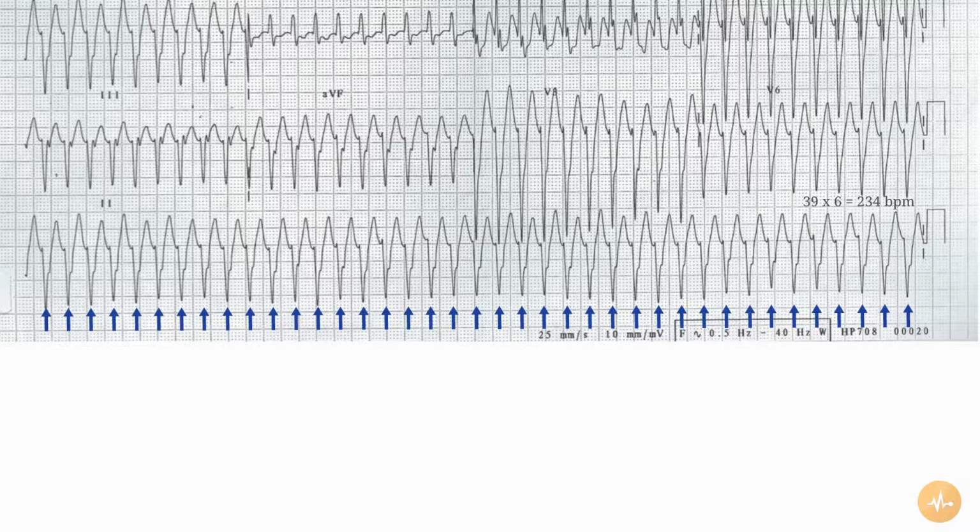This is therefore broad complex tachycardia and should make you think that the patient has ventricular tachycardia. In addition, one should treat the patient and not the ECG, and a combination of a rhythm at 230 beats per minute with hypotension and depressed consciousness should make one think that they need to cardiovert the patient, irrespective of whether this is a supraventricular or ventricular rhythm. The rest of the interpretation of the ECG therefore becomes somewhat academic.